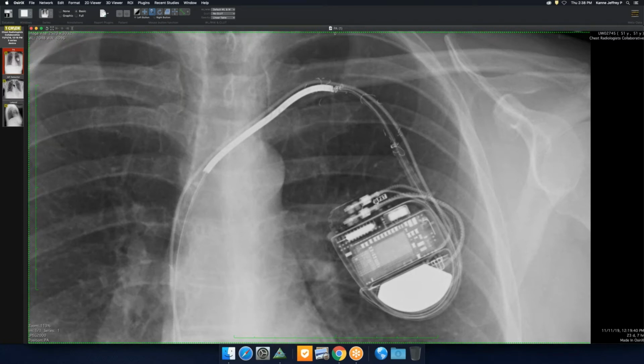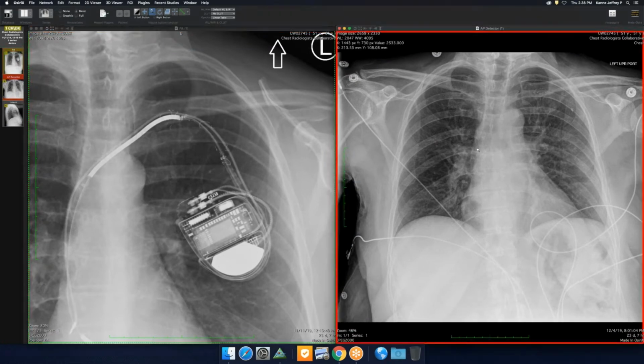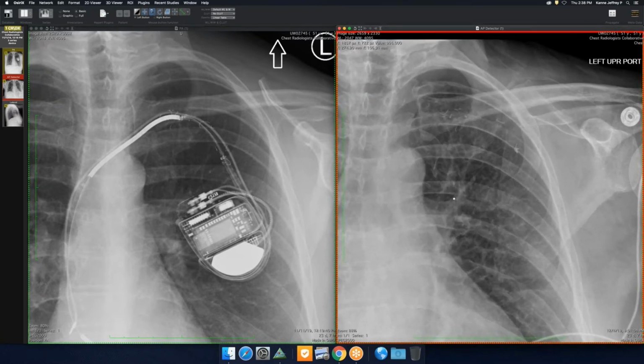I'll put up the post removal radiograph because you can see that actually these were all embedded; they were either endothelialized or in the chest wall. Most of them stayed behind when they took it out. And the electrophysiologists weren't particularly concerned because when they did their evaluation, I think they do a venogram and all that. They have all their little tools. They can see that these were clearly embedded in the wall and weren't going anywhere.